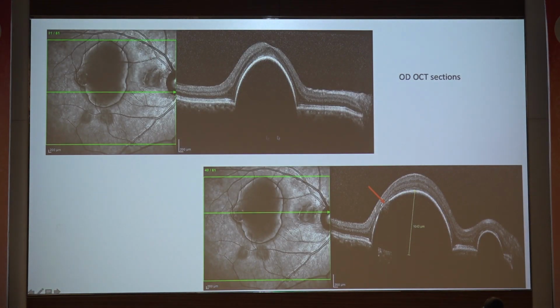If we see the OCT of the right eye, there was an extra large pigment epithelial detachment, and Bruch's membrane was not visible. I think that is most probably because of the large size of the PED rather than a hemorrhagic PED kind of feature. There was an area of RPE thinning superior-temporal to the fovea, and this is the other peripapillary PED that was there.